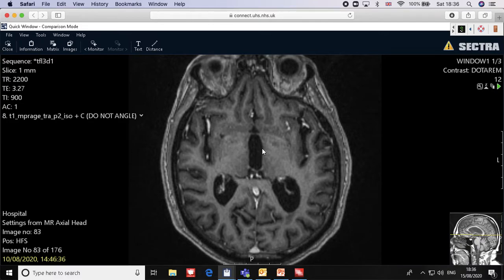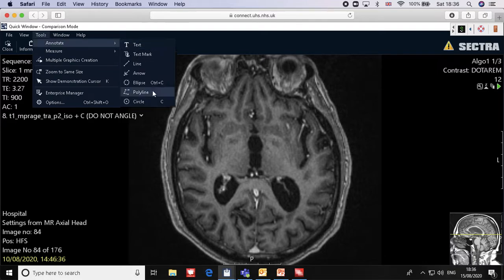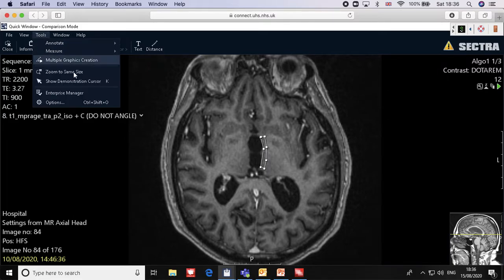And then when you go to the level of the anterior commissure slice, the guidelines are clear. Honestly, we didn't do that in the past at all. But now the guidelines tell us that whenever you see the anterior commissure, join the anterior commissure with the posterior commissure in a 3 mm thickness slice, and this will be your hypothalamus on either side. We'll do the same on the other side, and this will be the last cut of the hypothalamus. I hope this is easy.